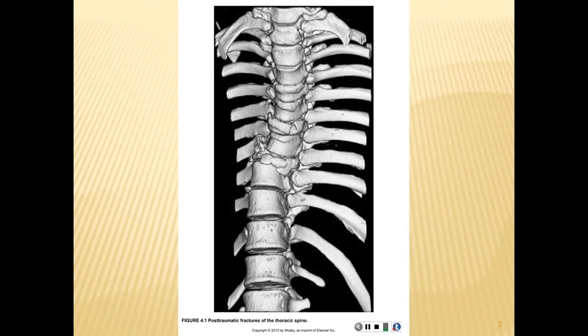Sensory and neurologic loss can be a result of injury or pathologic abnormalities of any of the many areas that constitute the normal anatomy of the region. It's important that we understand sectional anatomy of the spine. It may be able to save function to somebody someday.